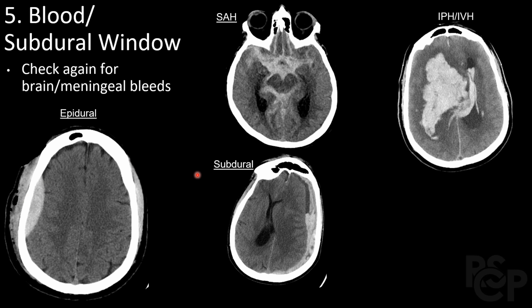If we contrast that to the subdural hematoma, it appears much more crescent-shaped, and this is because it's not confined to one suture space. In this specific example, we actually see layering of blood products. So you can see this area of hypoattenuation looks very different from the posterior regions here, which are hyperattenuating. If this is taken in the acute context, this patient likely has active bleeding along the frontal region here and clotted blood posteriorly in this hyperattenuating region here. You can also see they have significant mass effect and midline shift pushing their brain inwards.